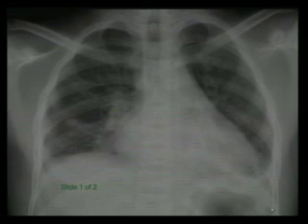Always look over here. Don't forget to look at the spleen. Look for a big spleen. If you see the stomach gas way over here medially, and if you have more of an abdomen and you see the hepatic flexure and the hepatic flexure is as high or higher than the splenic flexure, maybe there's a big spleen. You need to let them know that.